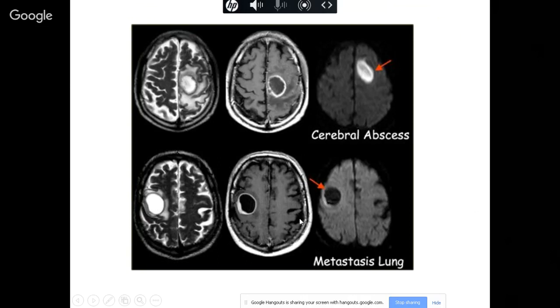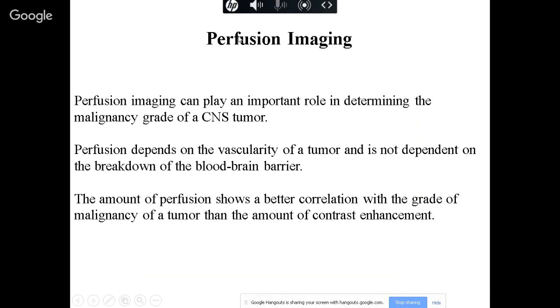But the way that you look at the degree of the vasogenic edema, you look at the wall, it is not very smooth. So I looked at this and said the major differential is the brain mets and the GBM, much less likely the abscess. This is important because treatment is completely different. If you say abscess, start antibiotics, and for the abscess you can avoid the brain biopsy, and the patient may respond to it. So that's what happened a couple of weeks ago when I was on call, and I said more likely mets or GBM, less likely the abscess, just because of the sequence of the diffusion. That makes sense? All right, perfusion imaging.